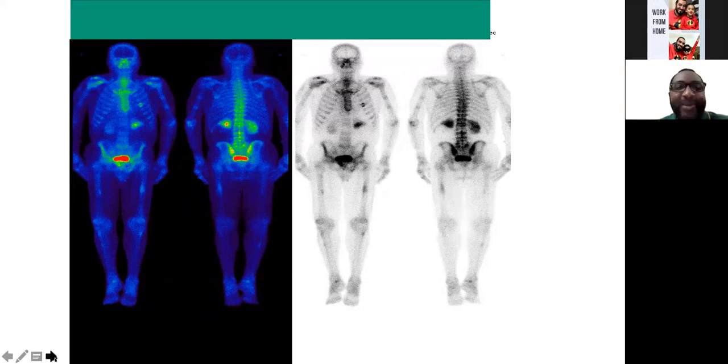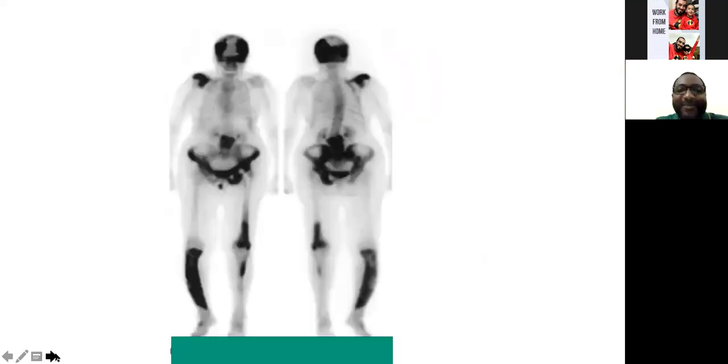So I'm very happy with this. Okay, so next. This is the history of a 58-year-old male patient who presented with severe pains in the right leg. Dr. Osama Ibrahim.